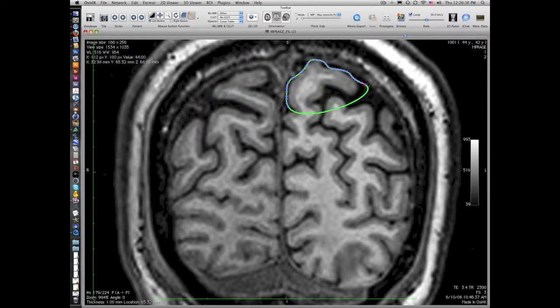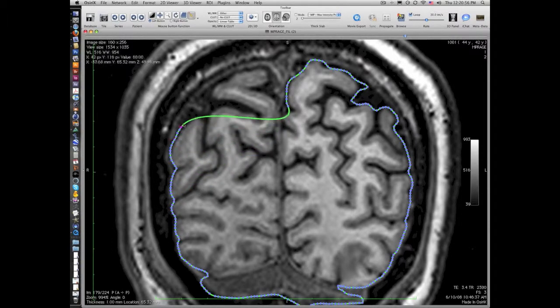I have a Cintiq that I use for doing this, and I think it's probably a little bit faster than a Wacom. It gives you a little bit better hand-eye coordination. I wasn't zoomed out far enough when I began this trace, so I couldn't really see the bottom of that. So this will be a good one to show you how to do the modification. I'm going to try to do this entire brain and show you sequences of it along the way.